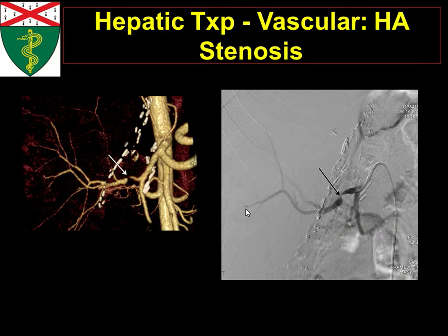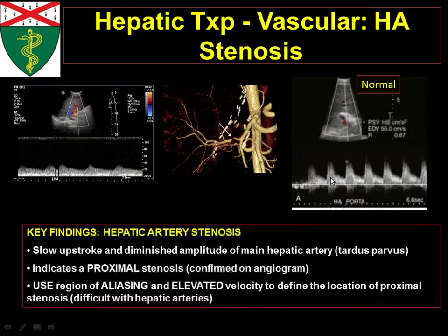So we brought them to our IR colleagues. Beautiful correlation. See how tight that stenosis is? They put a balloon in there, expanded that out. This patient did great, and she's still alive, and she gets her transplants. You'll see her sometimes in our reading room.